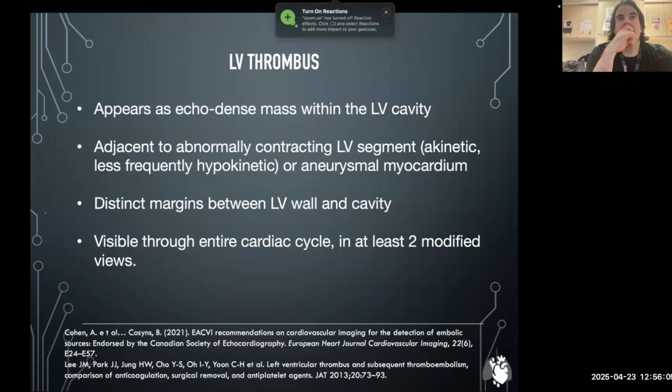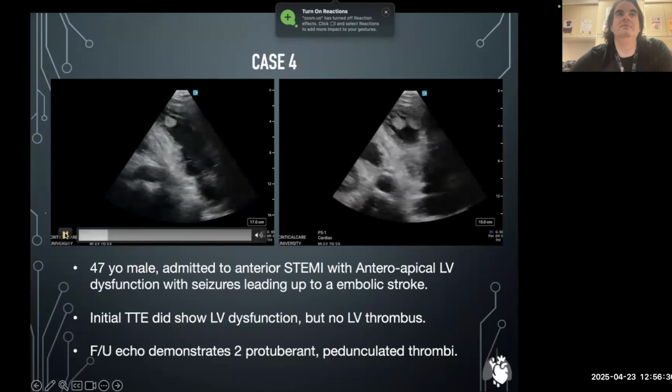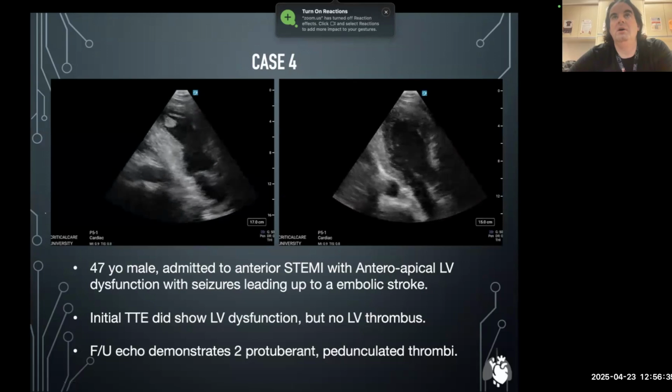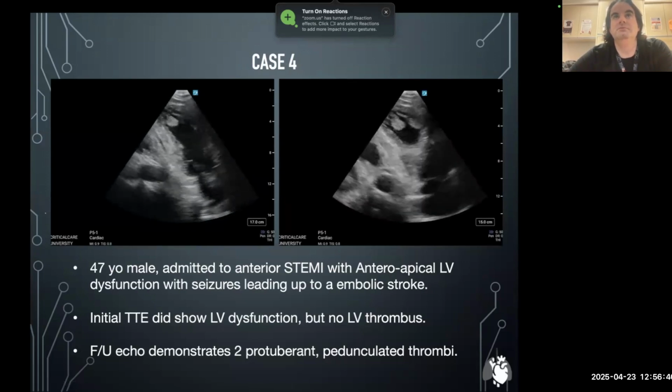The thing in non-cardiology world is that we don't like the Definity contrast, or some of this stuff costs like $100 a pop. So what we typically do on the non-cardiology side is we use what's called poor man's contrast. So as Brian had already mentioned before, in a transthoracic echo, you can actually see the LV apex fairly well, because when you do an apical view, the first thing that's encountered on the apical view is the LV apex, right? So what you can do is put a color box across the LV apex, turn the Nyquist limit all the way down to low flows, and see whether or not color completely opacifies the LV.